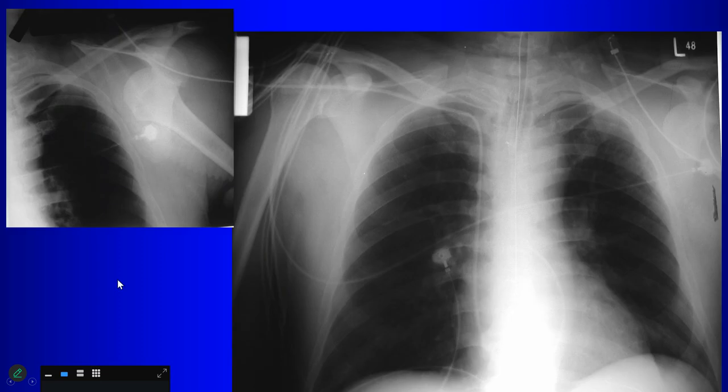When you're looking at your chest radiographs, what's the problem? Shoulder dislocation, right? And these are common, especially in trauma cases. This patient was in the ICU at the edge of the film. So to be systematic, you look at lines and tubes, heart size, the lungs, look at the bones, the edge of the films, to be systematic in your approach. And that discipline is what keeps you from missing important abnormalities.